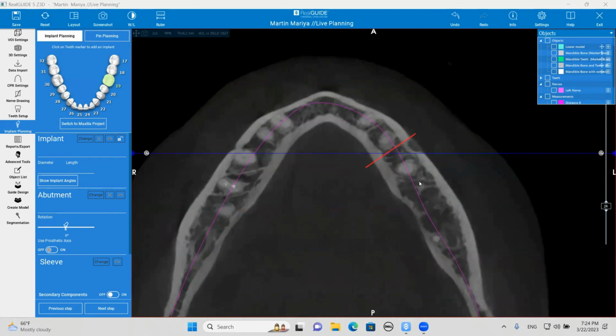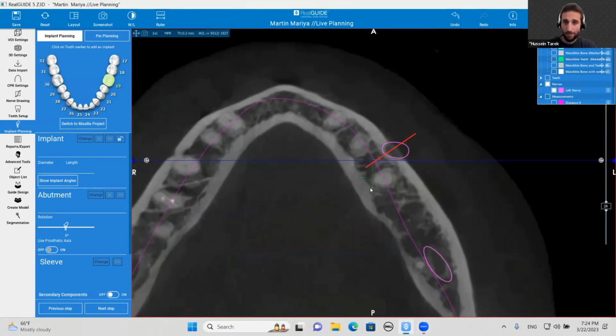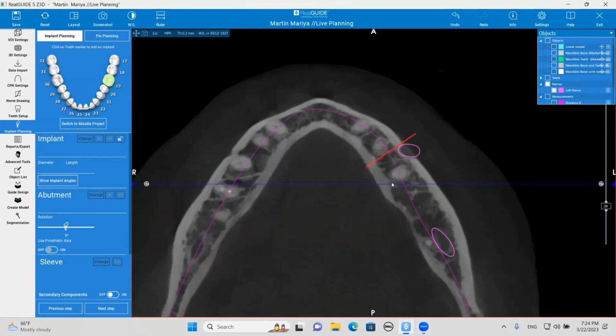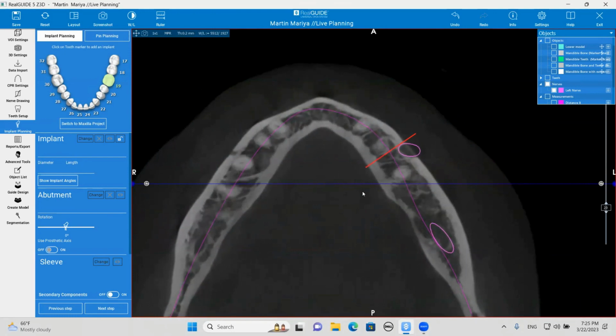So he made a mark, which is a perpendicular line on the anterior aspect of the mental foramen, and he's at the superior aspect of it. Now, Hussein, can you draw in the nerve? Yes, sir. So he has the nerve drawn in. Do you see where that pink is? Okay, go back a second. Yes, sir. Here we go. Go a little higher. So we're right at the superior aspect of it. Okay, keep going. Now you're going inferior? Inferior right now. That's right.